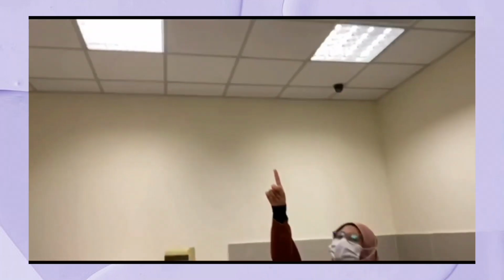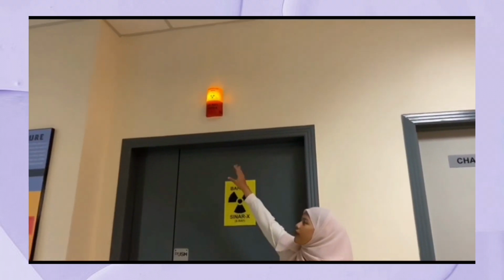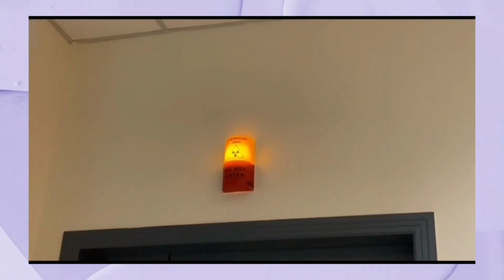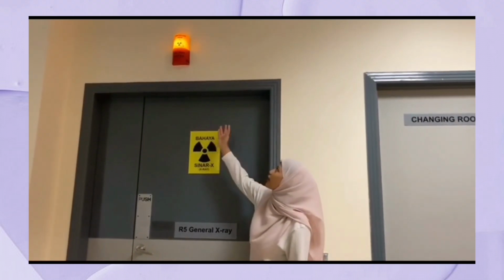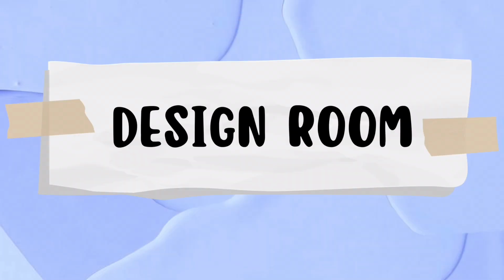Okay, so in here we have a darkroom safe light. So we will turn off the light, and the safe light will help us to see when we want to process the film. When the patient is exposed to radiation, this light will turn on. These are the warning signs. They are used as a precaution for the patient and radiographer.